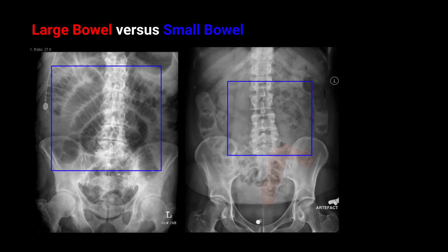So that's very person individual dependent. For small bowel, on the left image there, you have one that has a very distended small bowel in an obstruction case. And then on the right side of the image, you have something that's a little bit more within normal limits. You can see that when there is significant gaseous distension, it's quite trivial to determine that something is small bowel. But when there is no gaseous distension, the vast majority of the bowel loop segments are not going to be seen at all. They're either going to be collapsed or going to have fluid within them. And it's only very short segments that have a little bit of gas within. So that's a very typical appearance for small bowel. In general, it tends to favor the center of the abdomen as well.